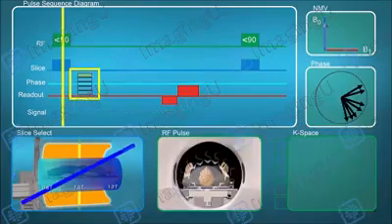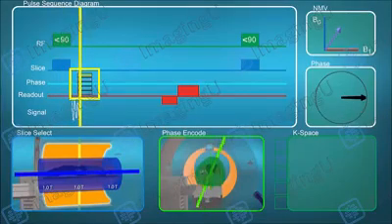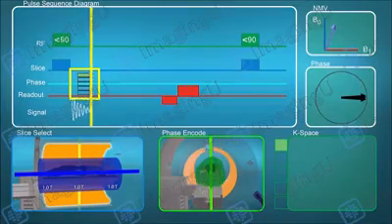If we look at the pulse sequence diagram, we see that the phase encoding gradient appears differently than the other gradients. This is because, based on the phase resolution of the desired image, we need to repeat the pulse sequence that number of times in order to fill K-space. Each time we fill a new line of K-space within the pulse sequence, we alter the strength of the phase encoding gradient. That is why it looks like a ladder.